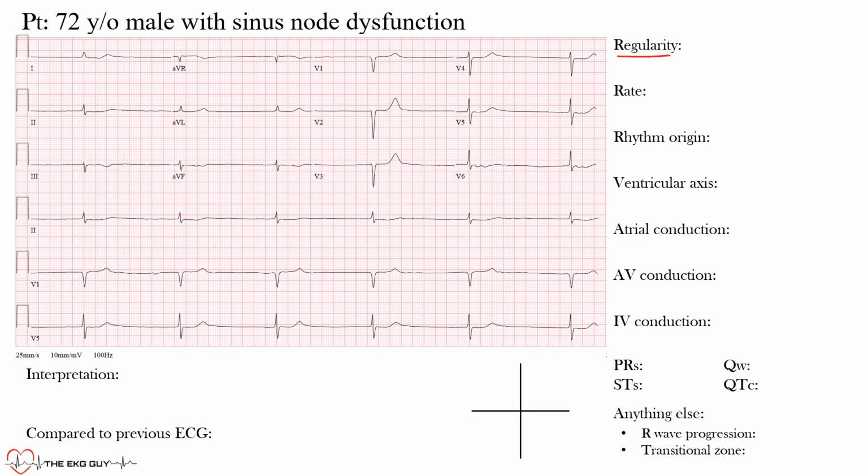In this case we want the regularities, meaning the distance or time between intervals, to be consistent for it to be regular. If it's not, then we would call that an irregular rhythm, and then from there we'd have to find out if there is any regularity to that irregularity. In which case it would be a regularly irregular rhythm, or if it was always irregular, such as an atrial fibrillation, which is an irregularly irregular rhythm. So let's look here to see what we mean.